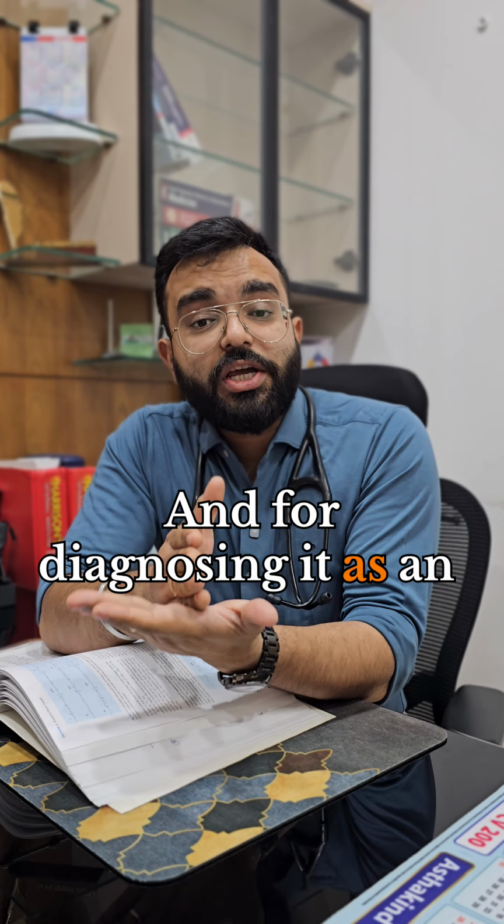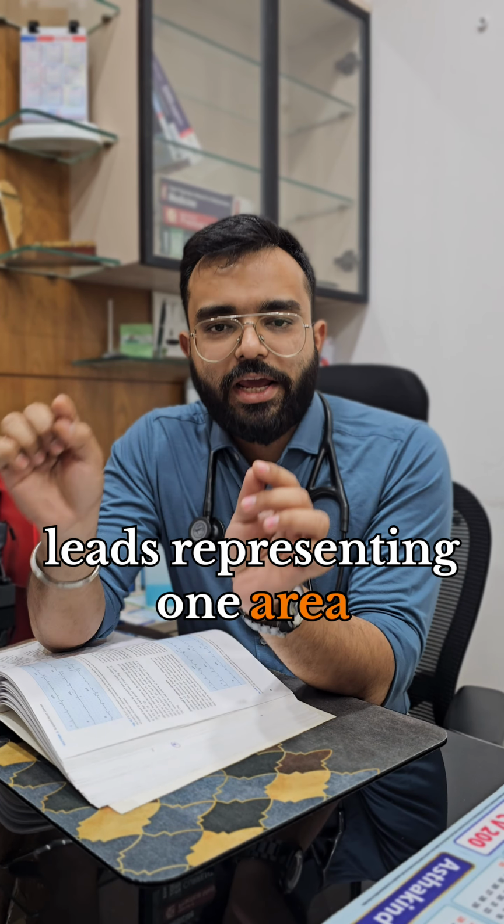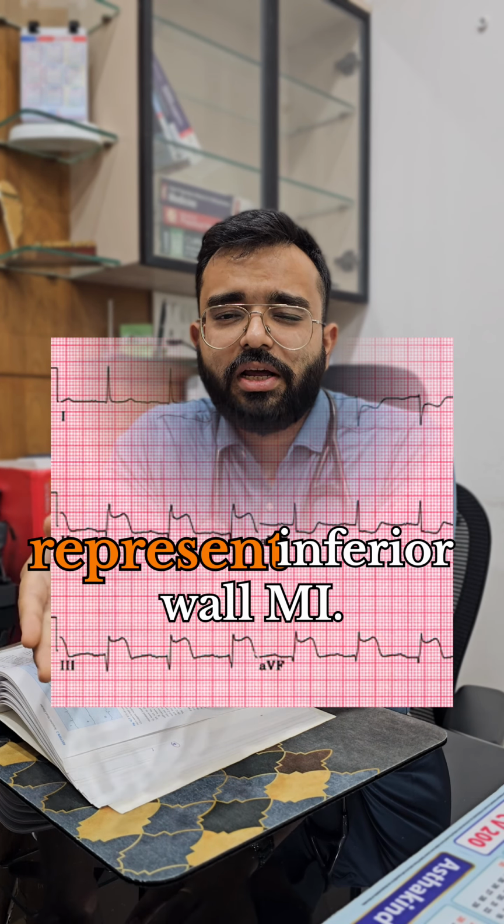And for diagnosing it as an ST elevation MI, the changes should be present in greater than or equal to 2 contiguous leads, that is, leads representing one area. For example, 2, 3, AVF represent inferior wall MI.